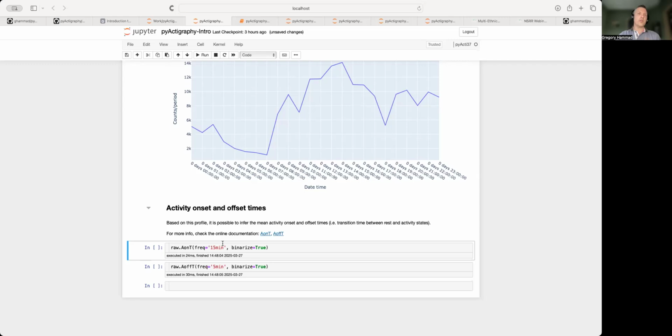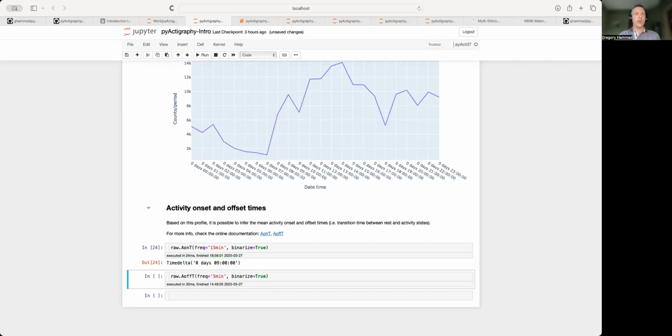We wanted to have something, but it's really coarse at the moment and would need some more refinement. And there is also a way to detect the rest period automatically on a daily basis. So there are dedicated algorithms for that. It's maybe less useful, but still it might be useful to get already an idea of the mean onset and offset of the data.